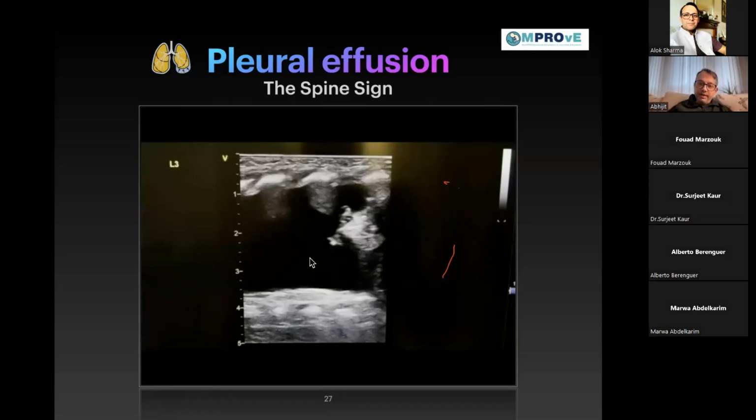If it is chylothorax, then do you have pneumonia with chylothorax? Might be, a possibility. Do you have a normal lung with chylothorax? Absolutely. If it is due to some other reasons, we just got a chylothorax and no other lung pathology, it's a normal lung. Are you going to see any conglomeration of the blood vessels there? No, your lung is normal. So as soon as you hit the pleural line beyond your fluid, chylothorax, you're going to reflect all your ultrasound waves back. So it's not going to show you any blood vessels. Yes, okay. Thank you very much.